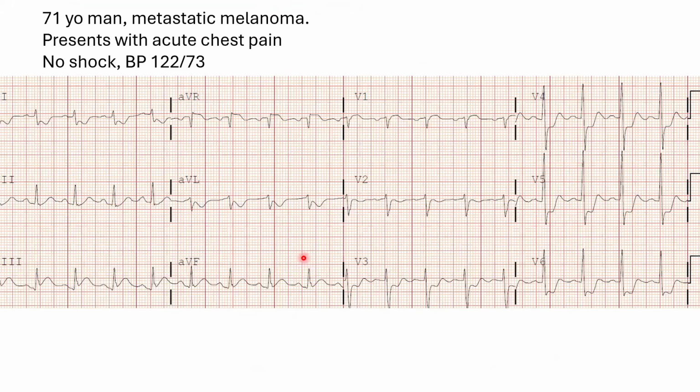This is another such case that illustrates my idea. This is a 71-year-old man who's presenting with acute chest pain. He has diffuse pronounced ST depression along with ST elevation in V1 and aVR and ST elevation in lead 3. This patient actually has left main or 3-vessel diffuse subendocardial ischemia with CTO of the RCA.